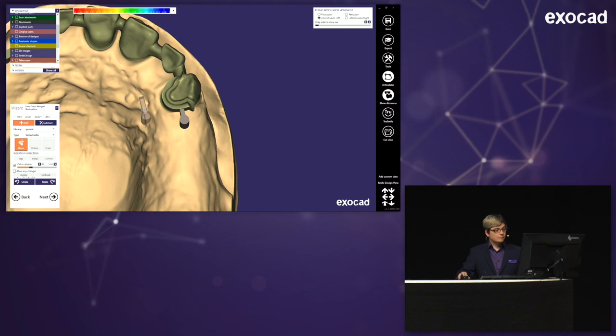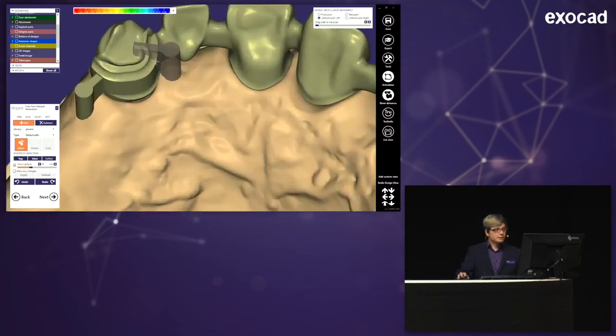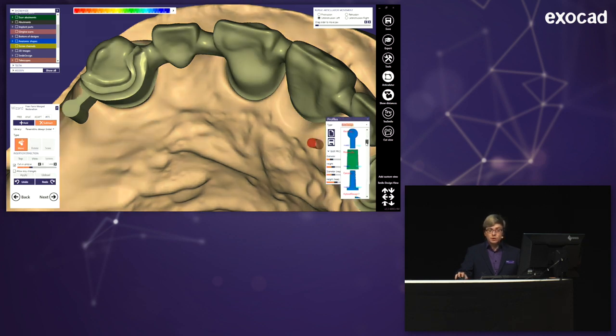Now, the even more interesting part than that are the rotation locks in the midlingual, where I'm also using attachments, but I'm going to subtract them. And here, as you might have already seen, are many shapes, but also some kind of weird informations here, like parametric rotation, which gives you the different shapes normally used for bars, and you can build attachments out of them. See, there's many shapes, and I'm looking for a specific one, this here.